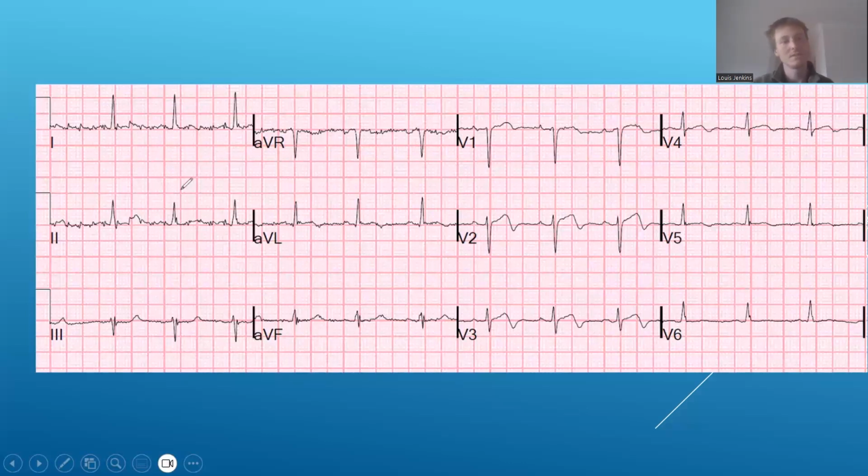of shoddy. If I'm looking at these limb leads over here, I can see there's a lot of artifacts. It's quite hard to determine exactly what the rhythm is. And I think in this case, don't be afraid to try and get a better trace, as long as it's not delaying treatment for this patient. But anyway, that's one of the first things I noticed.